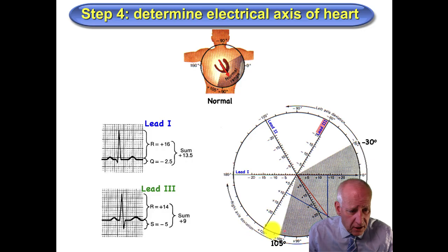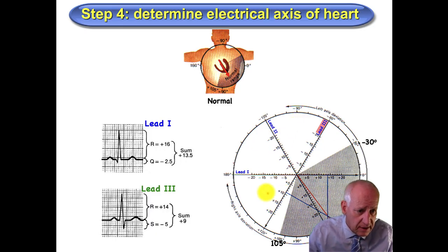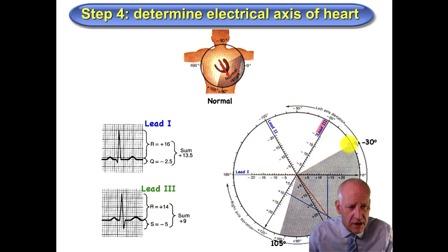And this plot here is called the radial coordinate diagram, and it is used to graphically determine the cardiac vector. It shows the lead axis for all 6 limb leads. If you measure hundreds of healthy people, you'll find that the normal electrical axis of the QRS ranges between -30 and +105. To calculate the axis, just examine the QRS complexes from any 2 EKG limb leads.